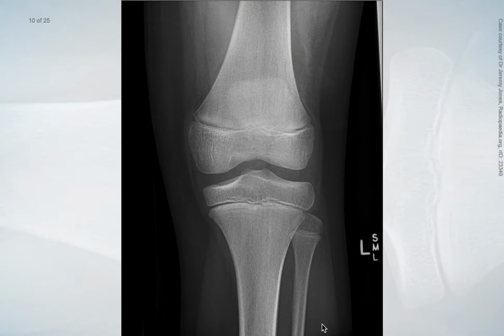The following quality criteria are used to determine if a PA patella radiograph has been produced with proper positioning and technical factors. Collimation does not obscure relevant anatomy. The femur superimposes the patella completely, and brightness and contrast are sufficient to clearly visualize the patella through the femur. The patella is not rotated, and there is adequate demonstration of soft tissue and bony trabecular detail.